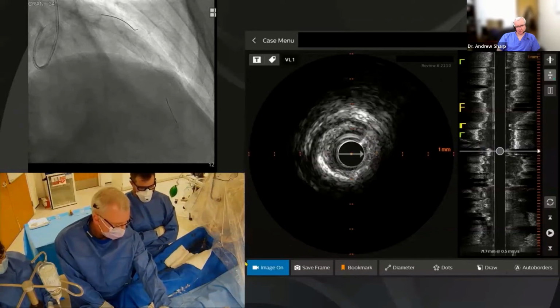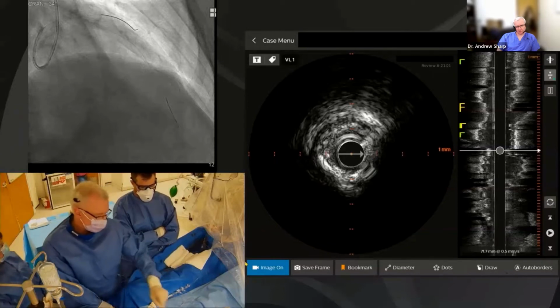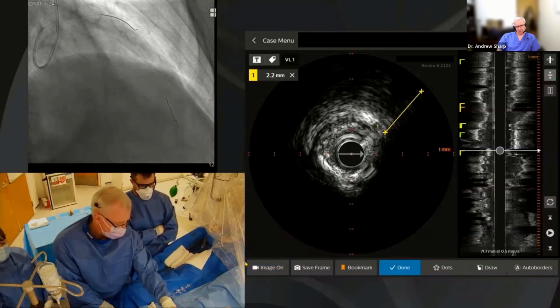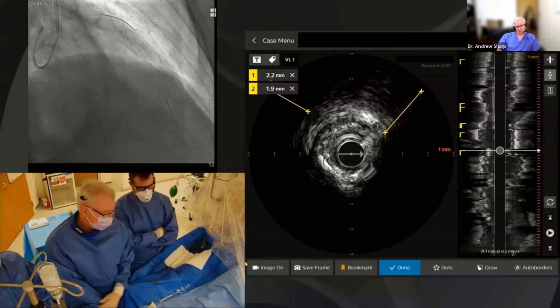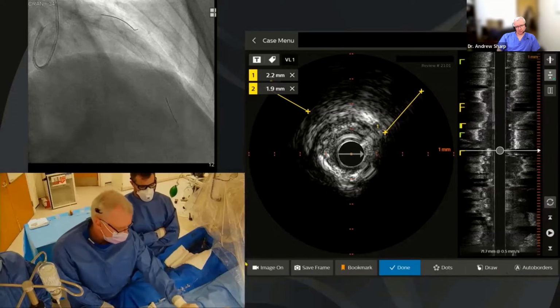Yeah. So at this point here, so if I just show there, this is a very good example of 3-quadrant calcification. So we've got calcification from there, and we see nothing round the arc from 2 o'clock all the way around to 10 o'clock. Now we do get a little bit of penetration here, so it's quite thin calcium from 9 o'clock round to 11, because we are getting a little bit through into the adventitia, but we're losing a bit of resolution.